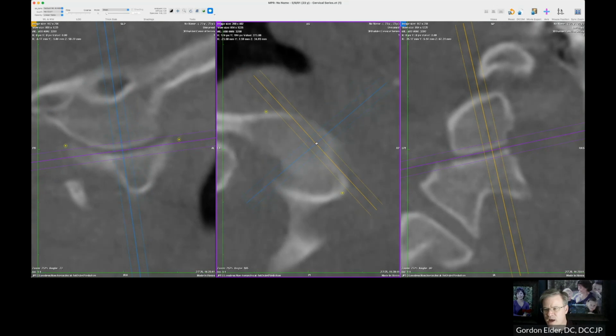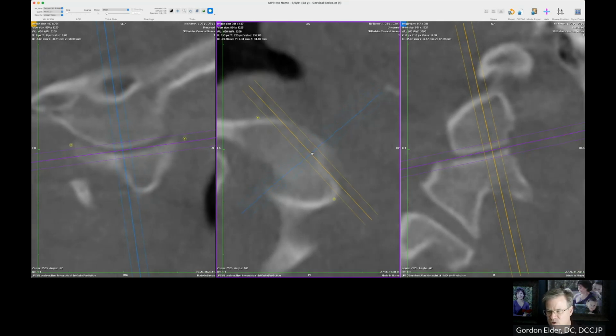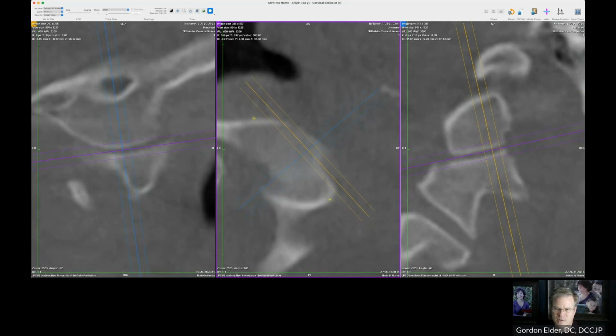So I'm pretty sure that this patient is even on the right, and that underlap there is because we're starting to look at the wrong part of the joint. And if not, it is going to be a minor part of the misalignment. So I might write it down as an underlap, S for slight, small s.